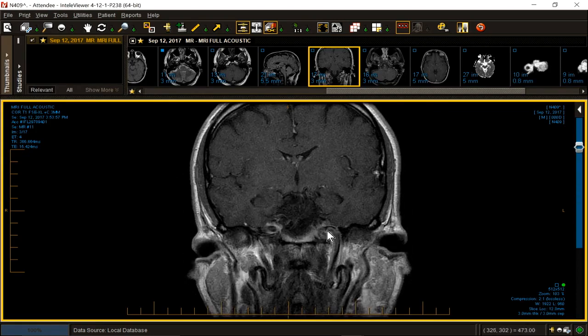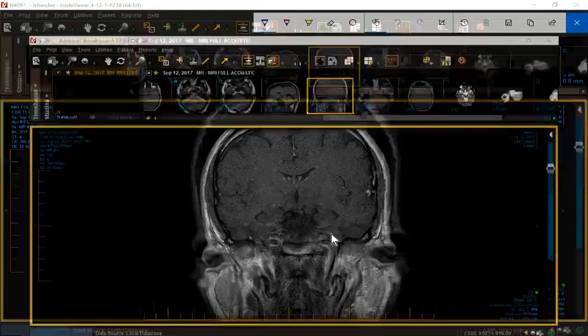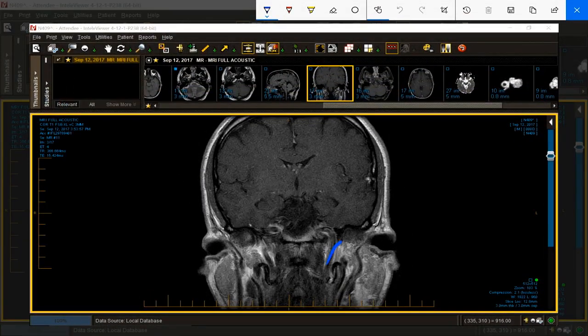Well, do we have that lateral swing of the carotid? The answer is no. It should swing about like this. It should come up and swing out laterally and then course over. Not doing that. So this is a pattern recognition abnormality.